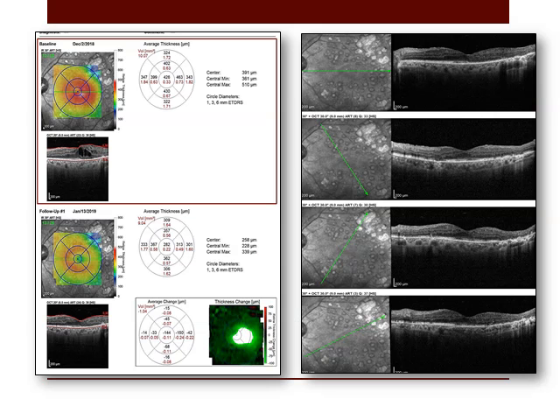It is important to know that in patients with diabetic retinopathy previously treated with laser, never follow them up with fluorescein, because it gives you hyperfluorescent appearance. You can't discriminate whether this hyperfluorescent appearance is due to fluorescein leakage or due to foveal hyperfluorescence secondary to laser therapy, or macular hyperfluorescence staining.